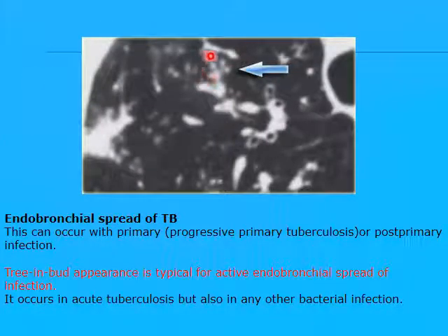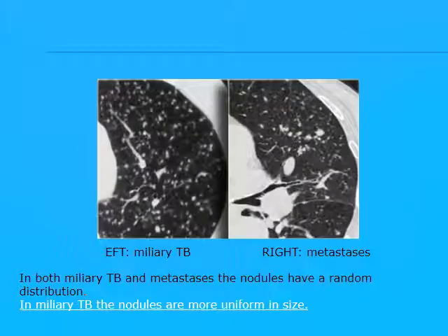Again, the very characteristic appearance of tree-in-bud in a case of TB. It means that we have active TB.